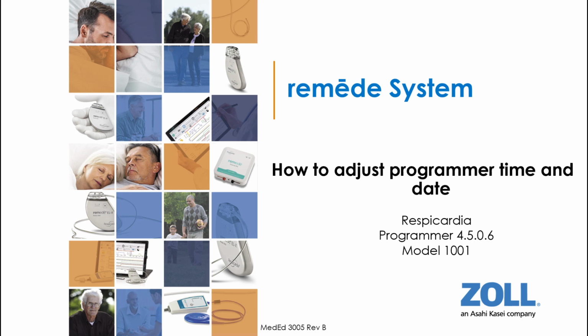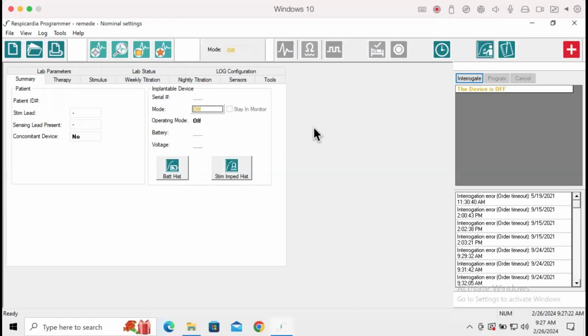To adjust programmer time and date on Respicardia Programmer 4.5.0.6 utilized for Remedy Model 1001. How to adjust programmer time and date if displaying inaccurately in the bottom right-hand corner. For this programmer adjustment, you will not need to have a Remedy device interrogated.